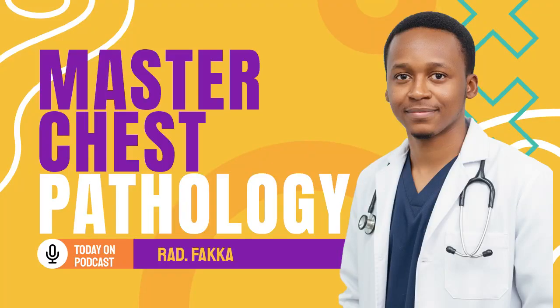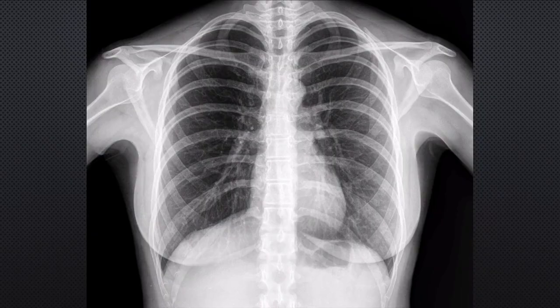In this lesson, we'll be talking about basic chest anatomy and a few common pathologic processes in the chest as seen on chest X-ray. This is a nice example of a fine quality PA chest radiograph. You'll notice that the medial ends of the clavicles are symmetrically positioned in relation to the spinous processes of the upper thoracic spine. This shows me that there is no rotation on the image.